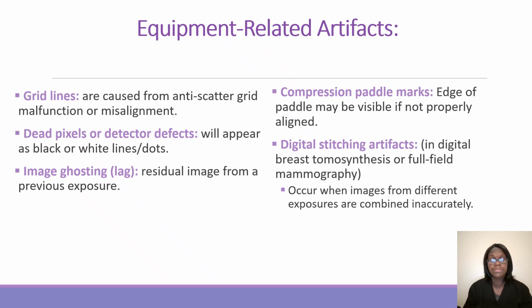I normally see this whenever you're taking your mammogram images and you see where your initials are, and your company name, your room number, I normally see those white specks or dots on the outer side of the mammogram image, like those dead pixels. You still have to let your manager or supervisor know, because a service engineer will have to come and see what's causing that. If you're noticing this on the outside of the images, what if it's on the inside of the image? That can look like calcifications, microcalcifications in the patient's breast as well.